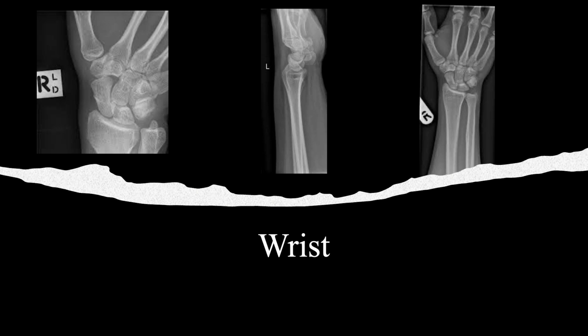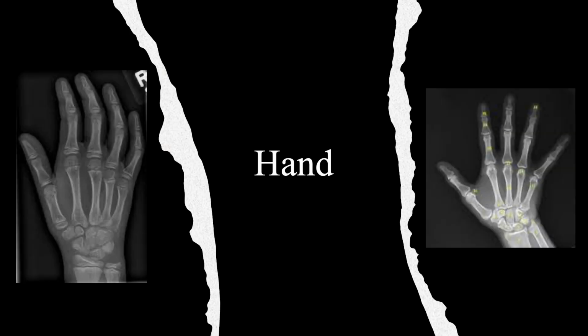All right, so moving on, I'm going to be looking at the hand. Going to be pretty straightforward as far as that goes. I like to, with the hand, start off by examining it and just looking 1, 2, 3, 1, 2, 3, 4, and just going down each finger, each segment, distal to proximal, to see if you see any fractures or dislocations. I like to start with that.